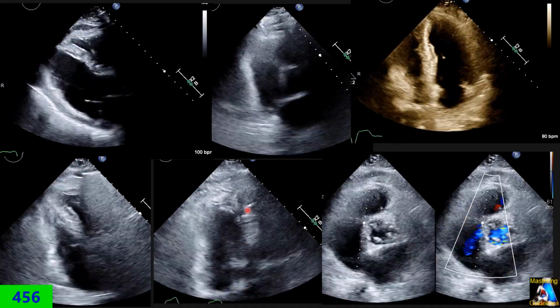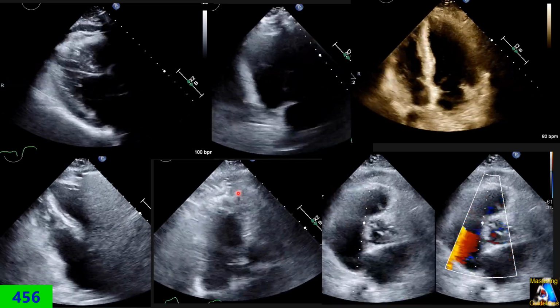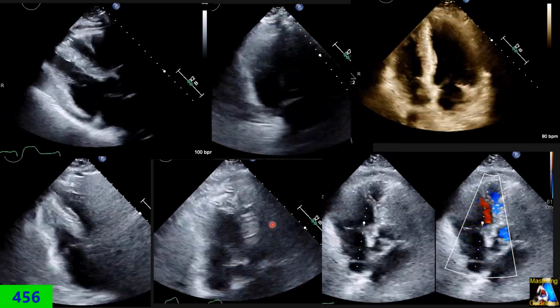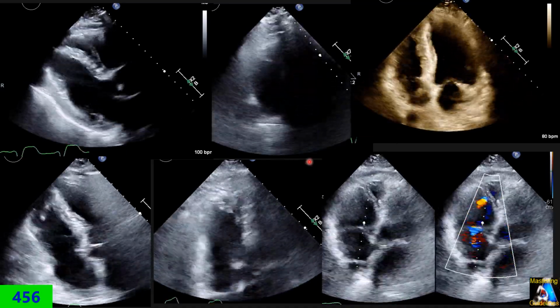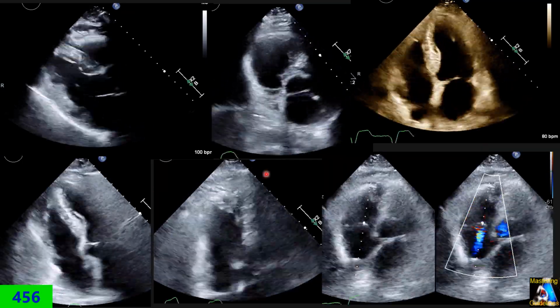Even in this case, it looks like the patient has some McConnell sign, but it's not. I explained in another lecture how we can differentiate it. Anyway, in this case, we cannot see the wire of the pacemaker. What do we have to do? It doesn't disappear or anything.